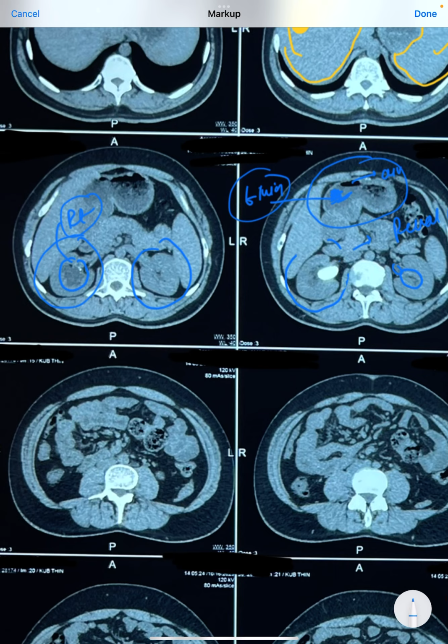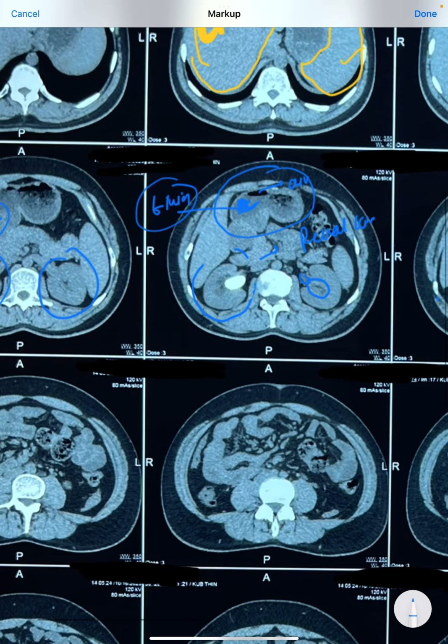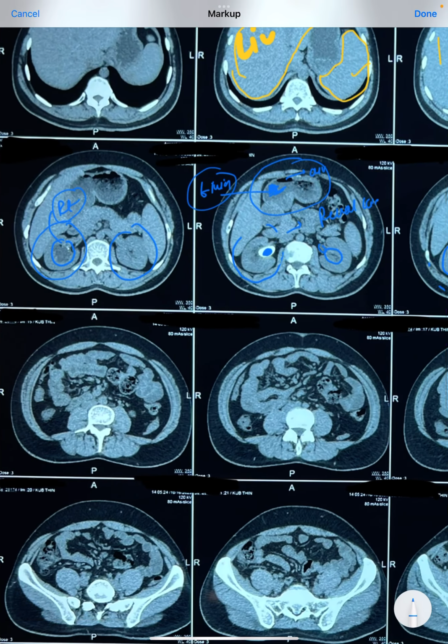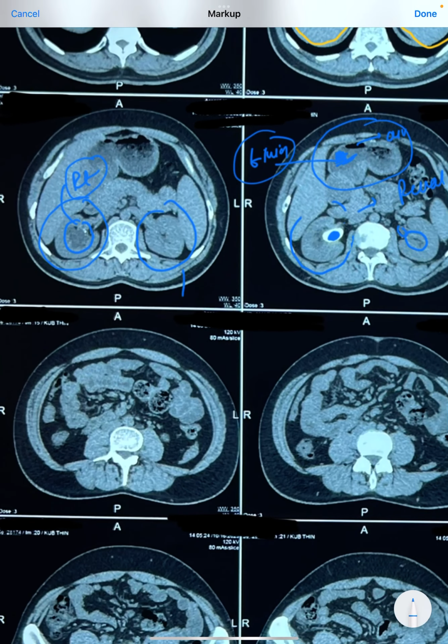in the left kidney, because there is no accumulation of the urine. In the right sided kidney there is accumulation of the urine, because the urine is not able to pass down, because there is an obstruction by the upper ureteric calculi. So this calculi is not letting the urine pass down. That is the reason why there is obstruction. That is the reason why there is hydronephrosis. That is accumulation of urine into the kidney.